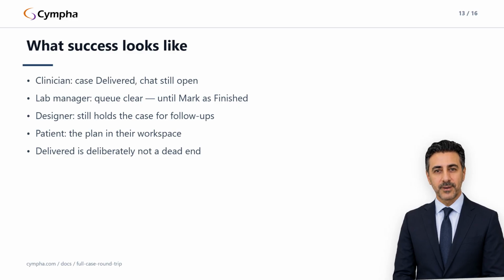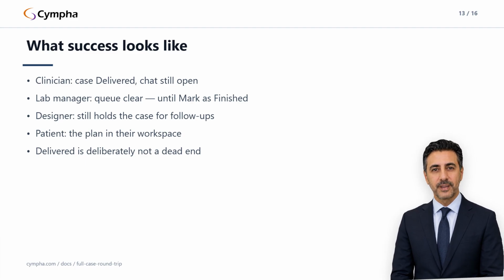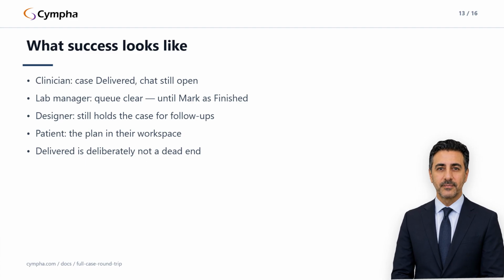And the patient sees their plan in their patient workspace, opens it in Studio, and gets ortho monitoring reminders if you enrolled them. Notice the design philosophy running through all 4. Delivered is deliberately not a dead end. The relationships stay live until the lab explicitly closes the case.